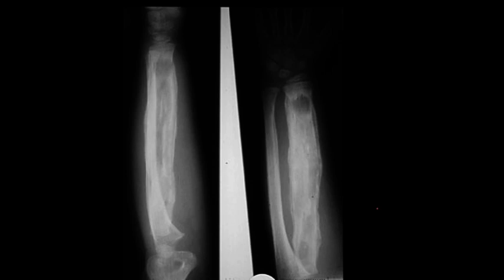This is a pretty classic example of only chronic osteomyelitis as a diagnosis. Melorheostosis doesn't tend to have internal destruction, which we're seeing here with this osteolysis. And Paget's disease is an older condition. So this is really just chronic osteomyelitis as a diagnosis.